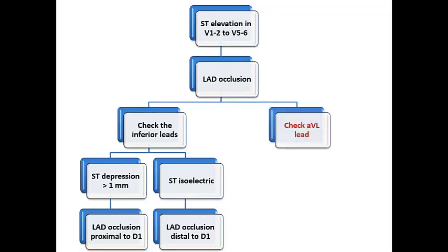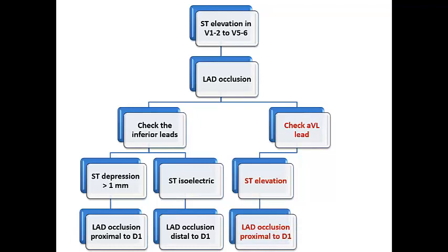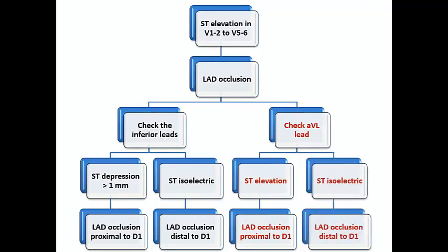I would also check aVL lead. If there is ST elevation, so I can predict that the lateral wall here is involved in the infarction, so mostly LAD occlusion is proximal to diagonal 1. And if the ST segment is isoelectric, so mostly LAD occlusion is distal to diagonal 1.